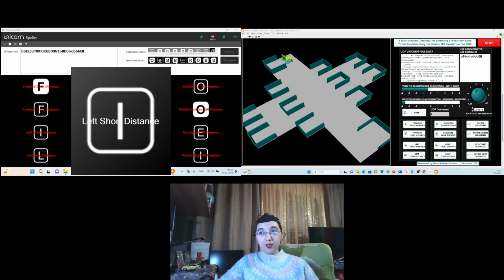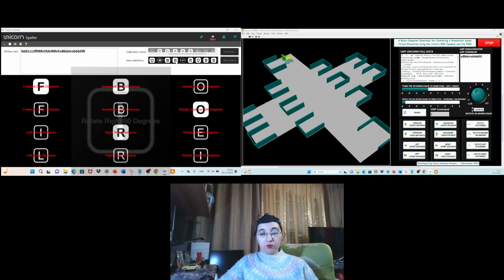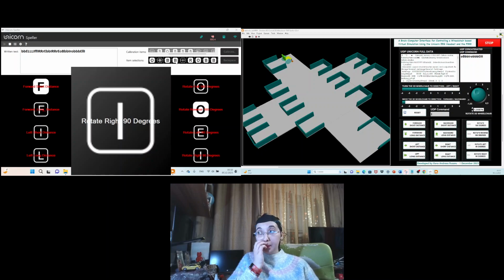Perfect. Okay. Rotate right with 90 degrees. Yes.